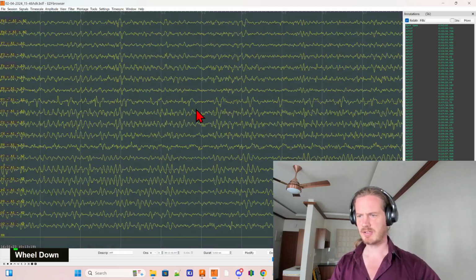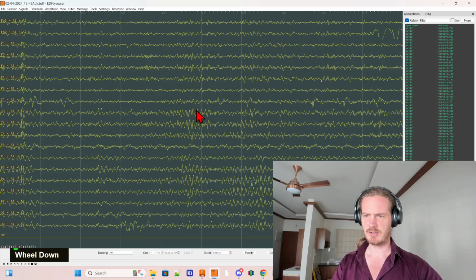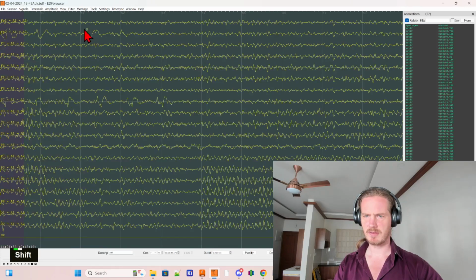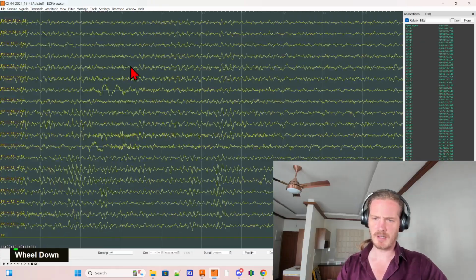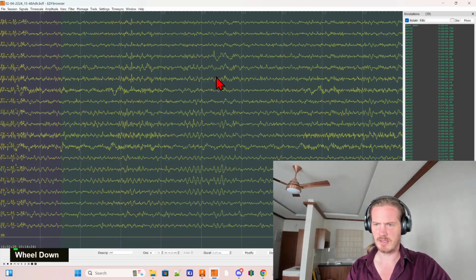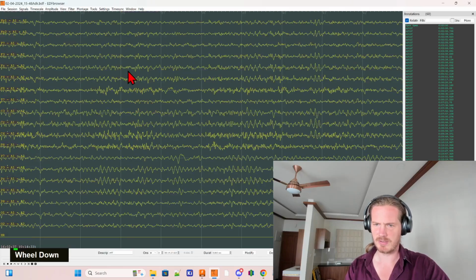So especially with the eyes closed period, typically you get very clean data. And so I don't mind cutting out big pieces because we'll be left with plenty of good data, even if we're vigorous with our removal. In the eyes open period, when people blink their eyes frequently, you'll get less usable data, and then I'm a little bit more reluctant to just cut out whole pieces.